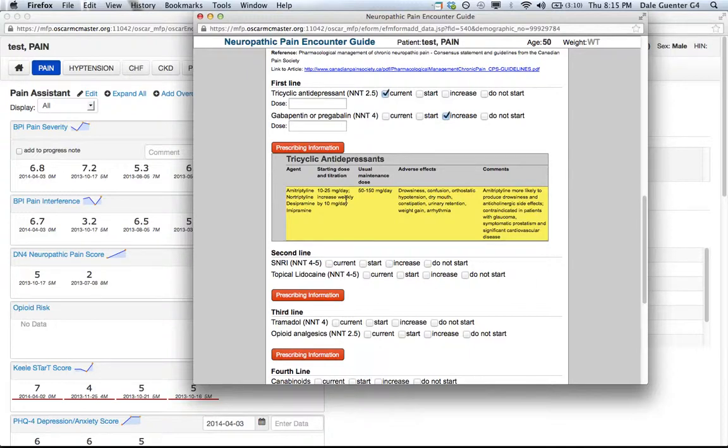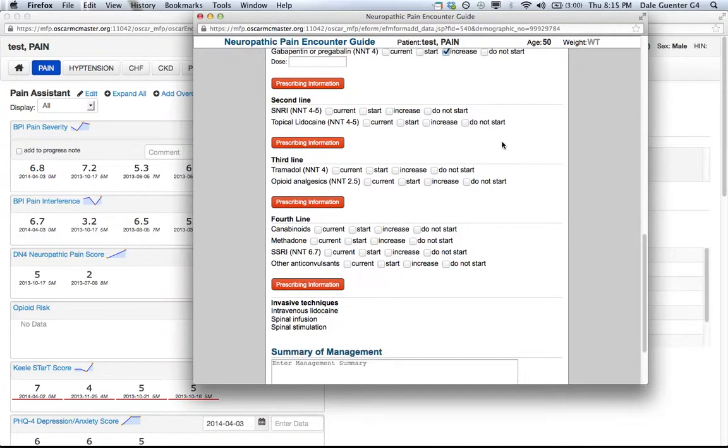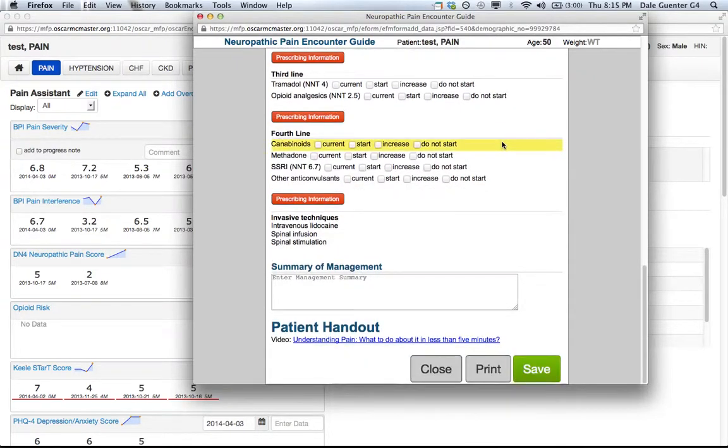each of the medications. So you can see that a clinician who is brand new to this field, a first-year resident, might use everything that is available, and a clinician who is experienced and knows what they're doing might use this simply as a place to record information about their patient. There are many different levels at which you can connect with this tool.